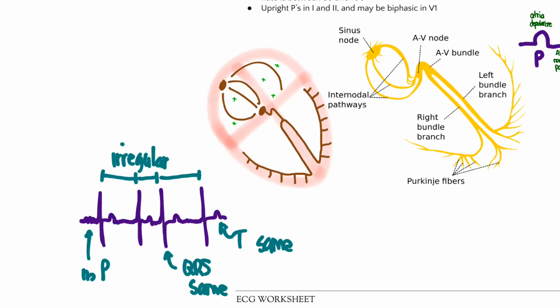So this is something that we call atrial fibrillation. Fibrillation is like this kind of wavy, shaky, tremulous waveform that we see here, and atrial because it starts in the atrium. And so the characteristics that we see is that it's irregular. We see no P waves. And so this is one of the atrial rhythms that we could see.